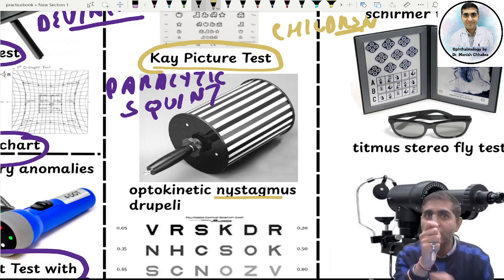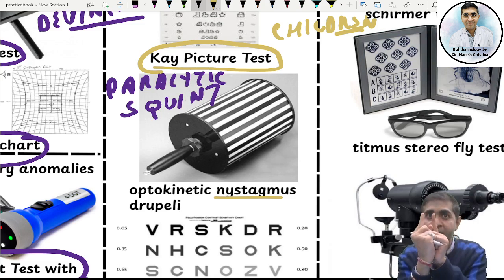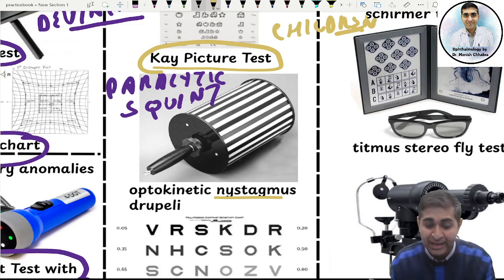So when you start rotating it, the child will fix his eye on the black stripe which is on the rotating drum. Once the black stripe goes behind, the child will fix his eyes on another black stripe, then it will go back, then a new black stripe, go back, new black stripe. So it is going to induce the horizontal nystagmus.